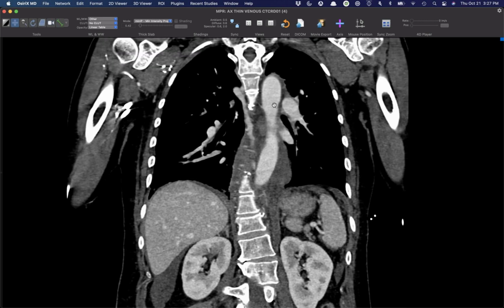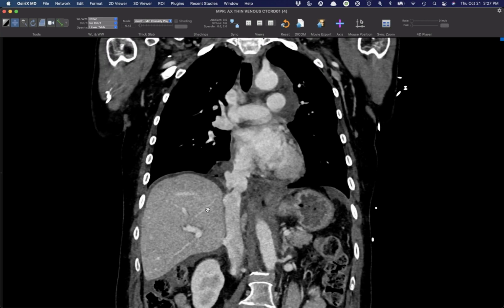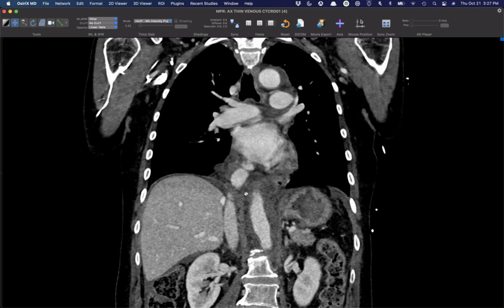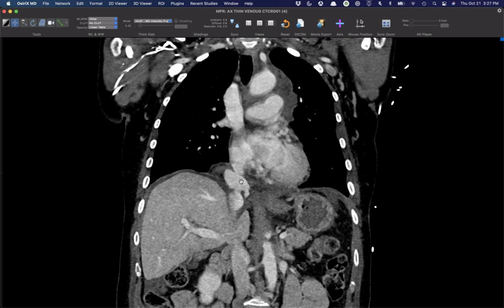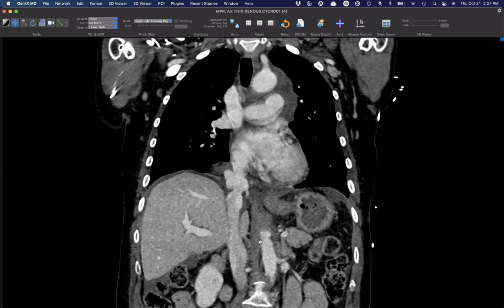They were thinking about anticoagulating for the minimal aortic injury. I don't know if that's necessarily prudent in the setting of the IVC injury, but yeah, that's the new finding for me right there.